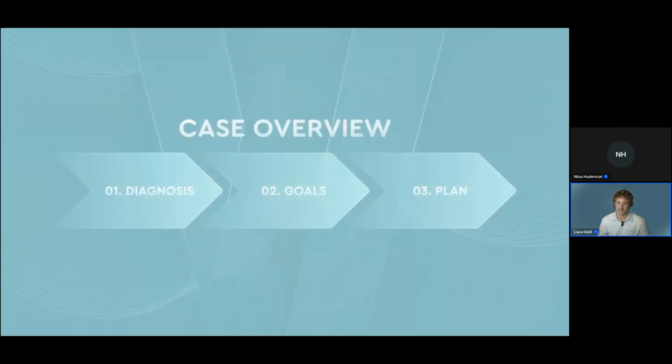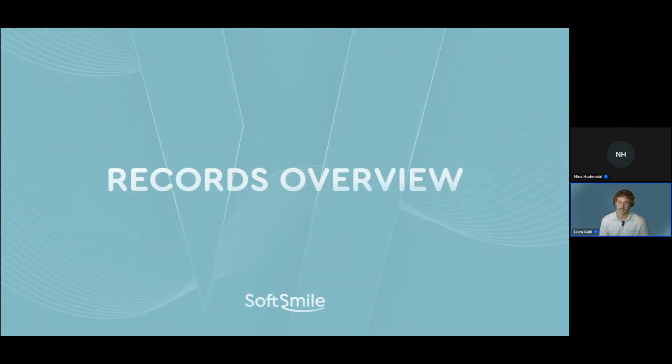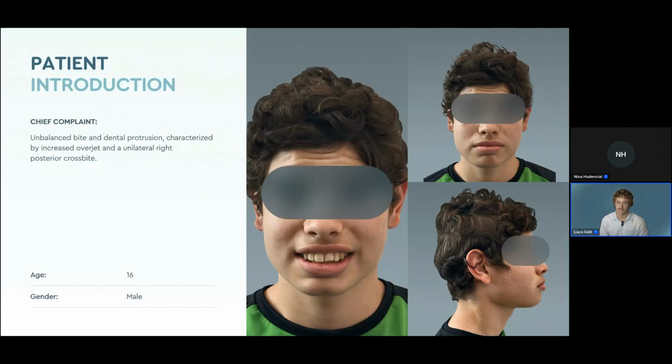So let's get started. Here's our agenda for the session. We'll begin by establishing the diagnosis baseline, outline our specific treatment goals, and finally detail the treatment plan and mechanics required to achieve them. So let's dive into the diagnosis records.